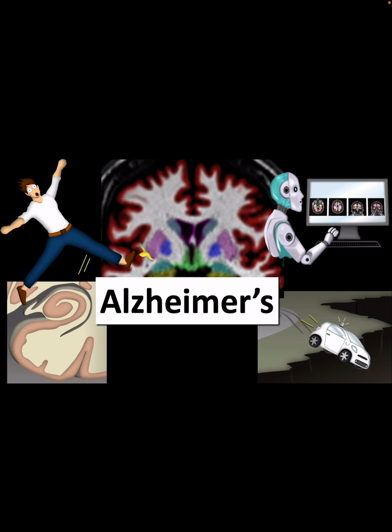It is overwhelmingly the most common type of dementia. So one of the most important things to look for when you're looking at a scan for Alzheimer's is whether or not there is volume loss, and if there is volume loss in specific regions. So when you look at a scan for Alzheimer's, do you just kind of gestalt the volume loss and hope no one asks any more questions? Does your practice use automated software to provide the answer? Or maybe there's a better solution than both.